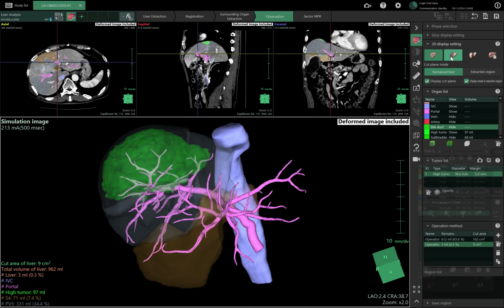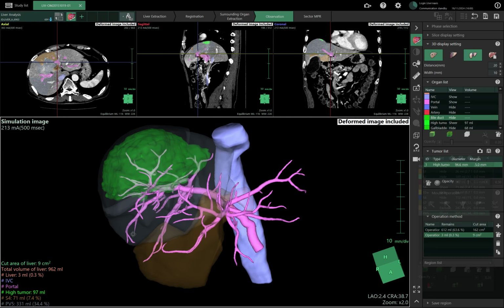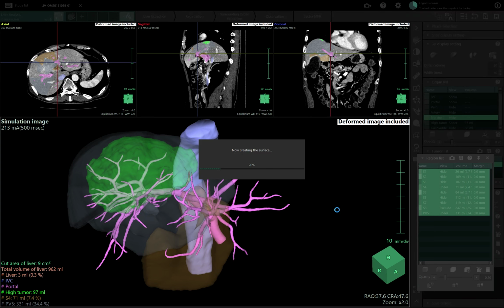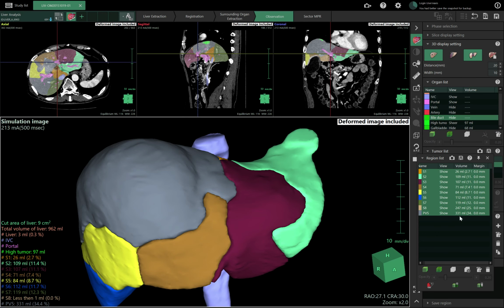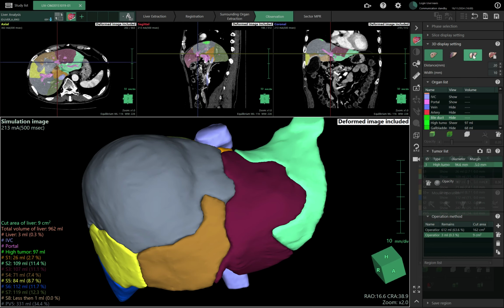But it doesn't matter. We can show this, which will make appear, let's say, a space between the extracted regions. I will set them to opaque to show them. Here, if I set this, the segments are not exactly regions, so this is why it doesn't appear.